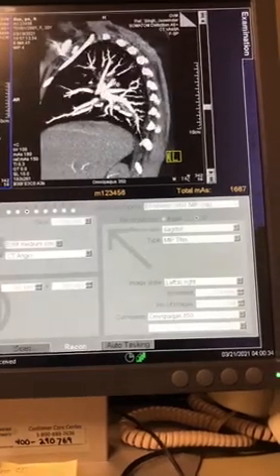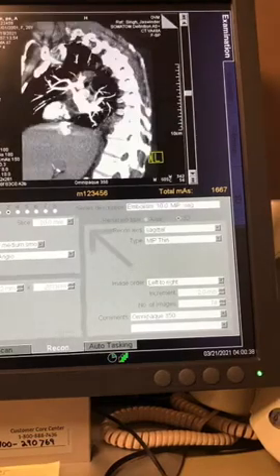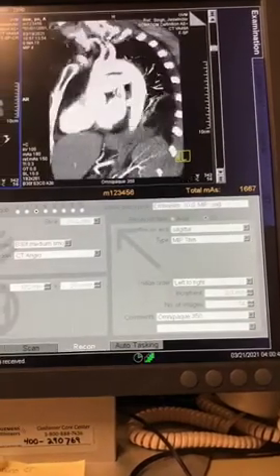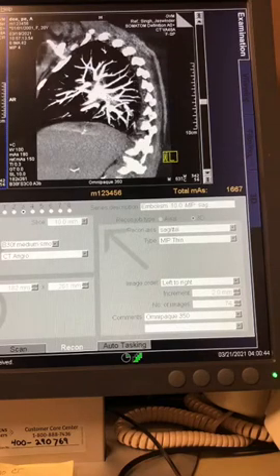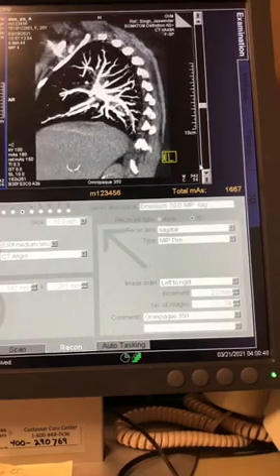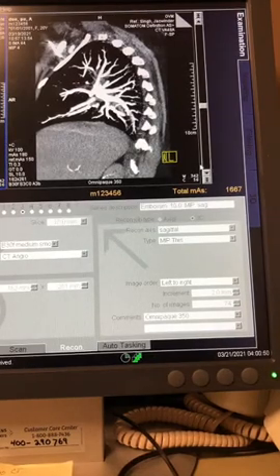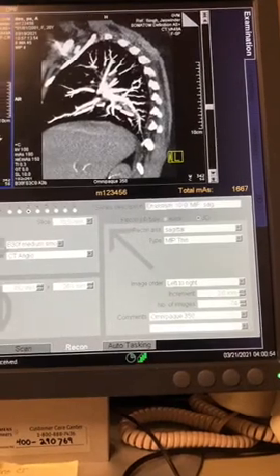Now, I brought this up to my rads, but they were used to what they were reading. They didn't want it. I saw this protocol on a site visit down in Texas when we were trying to buy a scanner, but look at that. It's right there, and then every branch. If you saw a clot, you could follow it pretty easily on this, but that's an oblique. If you want to, run it by your rads once they trust you and see what they say. All right, so there's our PE protocol.